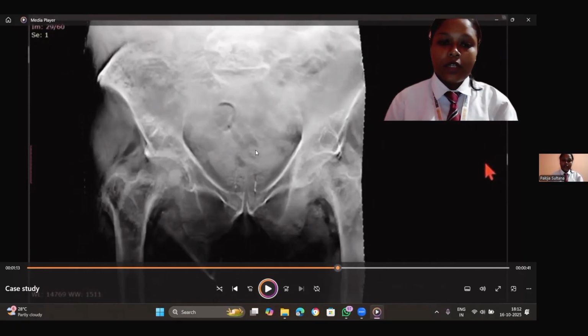What were the outcomes? Improved detection: fractures that might be hard to visualize on standard X-ray become visible. Localization and characterization: the system helps determine the precise fracture line, displacement, and involvement of adjacent structures. Low radiation dose: the dose is significantly lower compared to a CT, making it safer for fall patients.